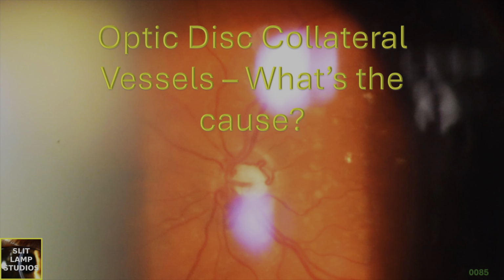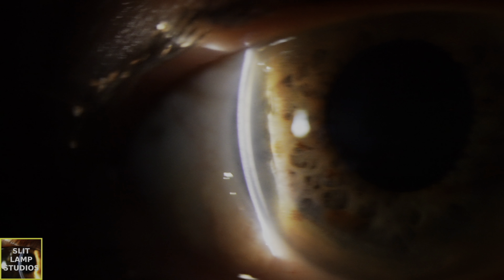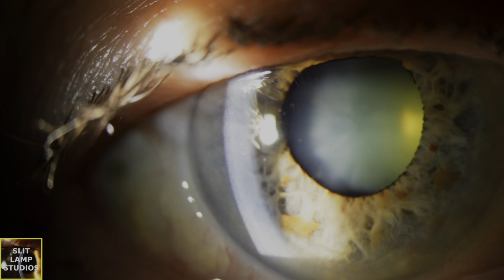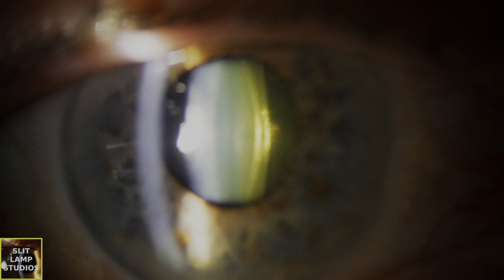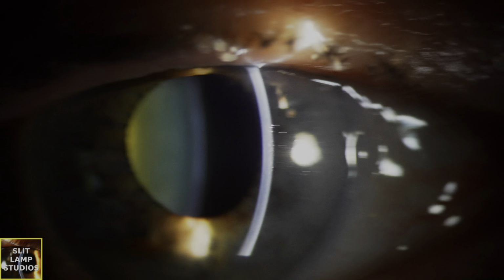Optic disc collateral vessels. What's the cause? In this patient, the cause is a previous central retinal vein occlusion. Disc collaterals, also known as optociliary shunt vessels, are dilated venous channels seen near the optic disc, and they develop as a secondary response to chronic central retinal vein occlusion.